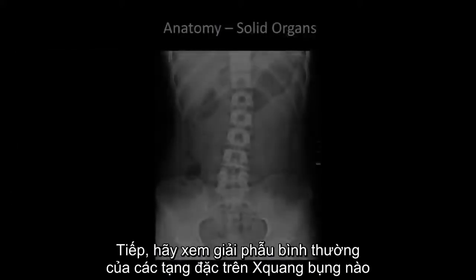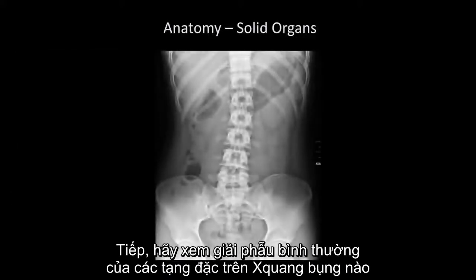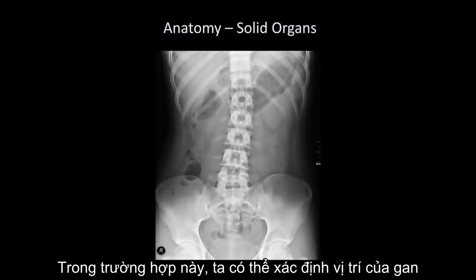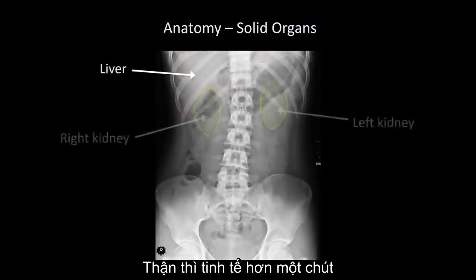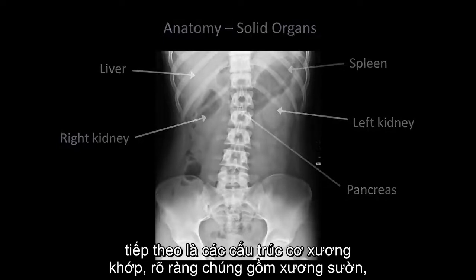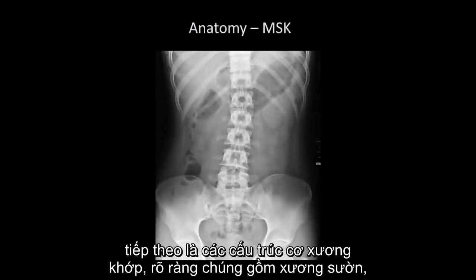Next, let's look at the normal anatomy of solid organs on abdominal X-ray. As mentioned earlier, the solid organs are all poorly visible on plain radiographs. In this case, we can identify the location of the liver. The kidneys are a little more subtle, but a normal spleen and pancreas will not typically be visible on plain films. Then there are musculoskeletal structures.